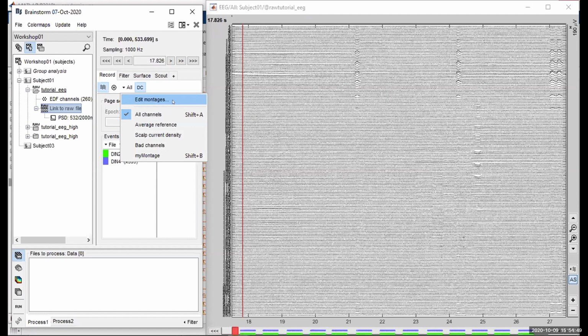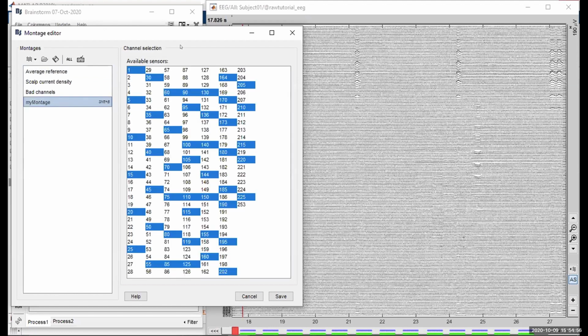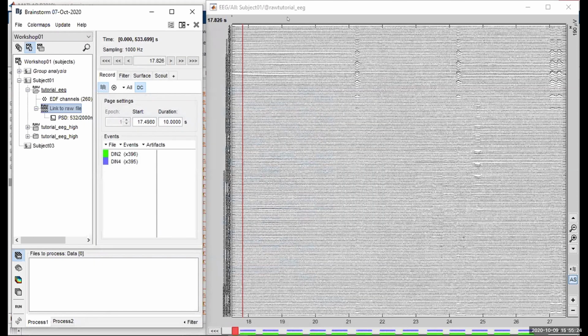What you can do is go to edit montages, and you can create your own selection of channels. I actually made one just before this presentation where I very randomly selected about every five channels, just to have a nice subset that fits correctly on my screen. But you're free to make whichever selection you think would be useful for you. And what is nice is you can add a custom keyboard shortcut. For example, here I added the Shift B shortcut.